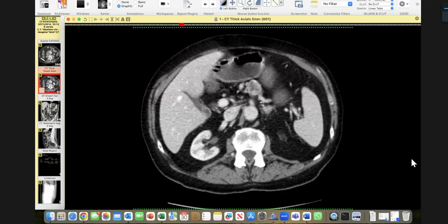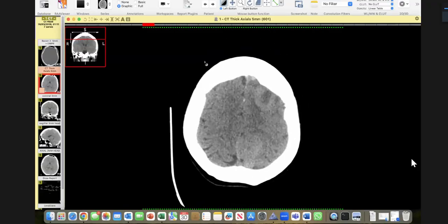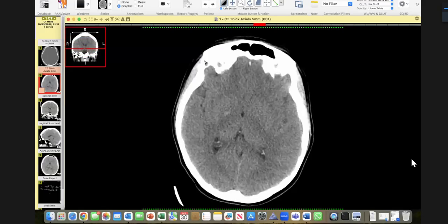Key point is to look for arterial phase enhancement. And if it is around this region, even in the small bowel, arterial phase enhancement is the key. This is a neuroendocrine tumor. So I was not interrupting you just to see how you close the case, and you took too much time. I think part of the problem in this case was that when I was asking you questions, maybe it was not projecting on your screen.